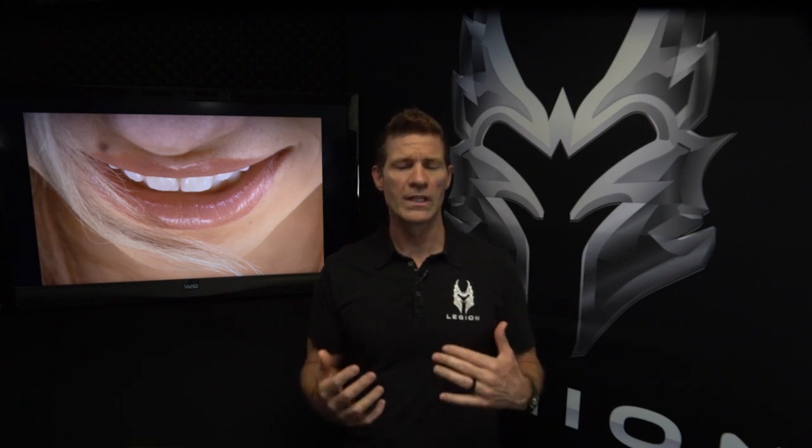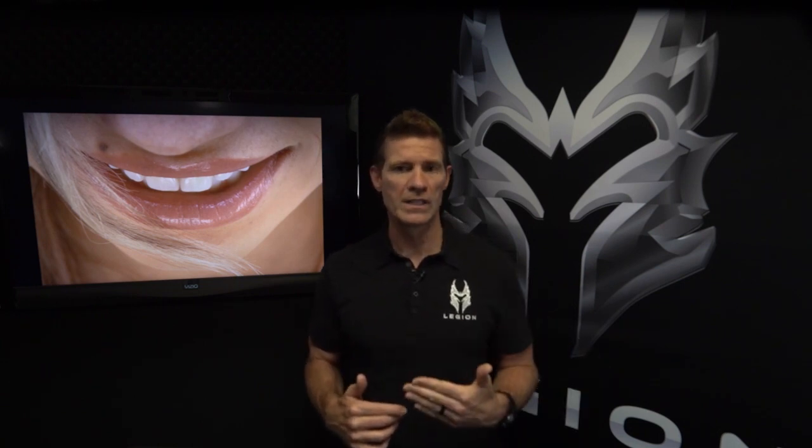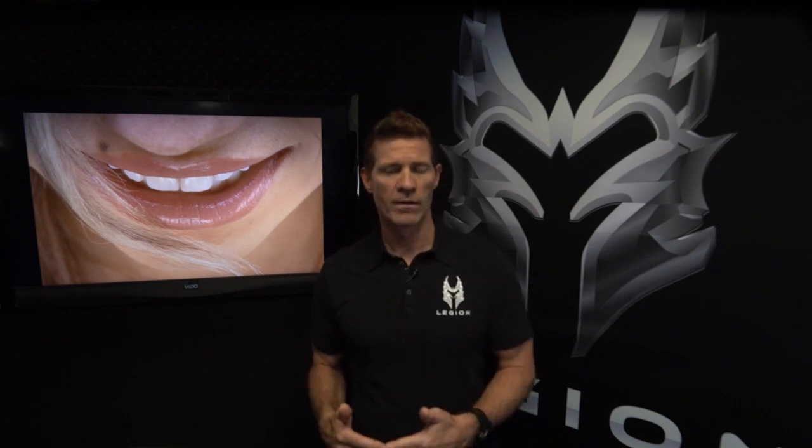Okay? So again, looking from a different angle, we can see tooth position, we can see angulation, we can see lip position. We're looking at all of these to assess the overall appearance. And should we like this, we can move forward. Should we want to move teeth forward, we can see how much room we have. Should the teeth already be too far forward, then we recognize we have to move things back. So based on all of these items and more, we can determine where we want to position teeth and what needs to be changed.